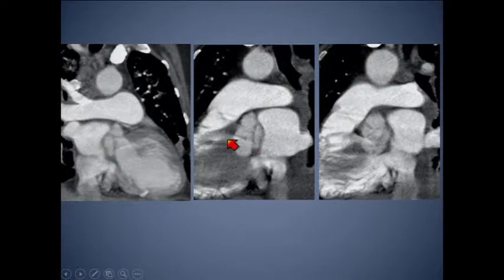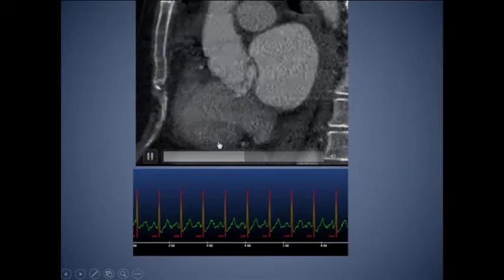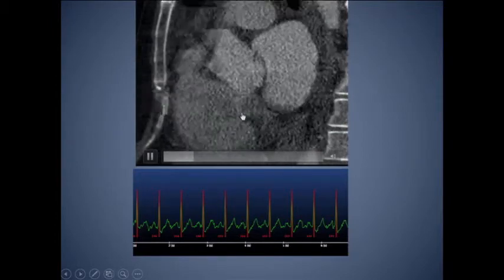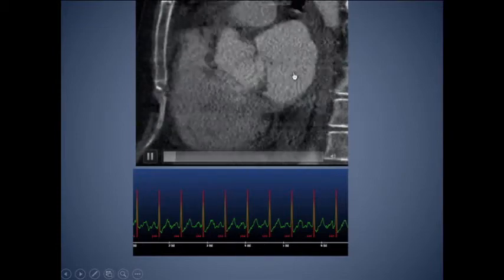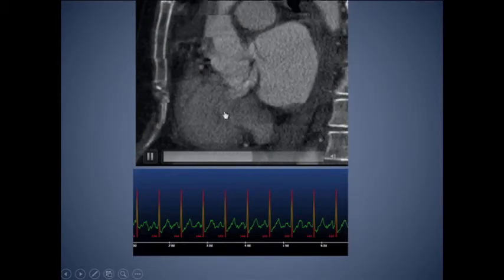We had reconstructed her data very quickly to show the same thing. Then I actually went to lecture the medical students for 2 hours and told Friedrich she may come down for a cardiac CT if they can get her heart rate controlled, but we're hoping they'll just do a TEE on her. Well, what they did was they sent her down without heart rate control. I came back from lecture and Friedrich had these images for me. He said she had a heart rate of 104, but they said they're not going to get the TEE till later. Can you just scan her? So even through the world's most awful cardiac CT images, you can still see this collection, and you actually get the hint that there's a little squirt of contrast going into her RV.